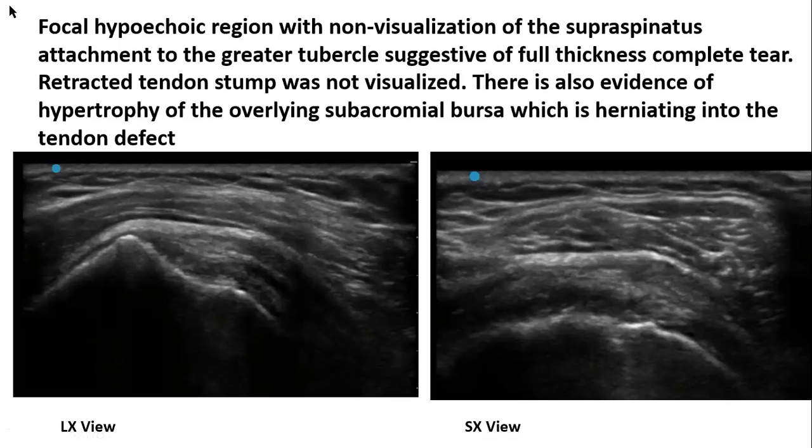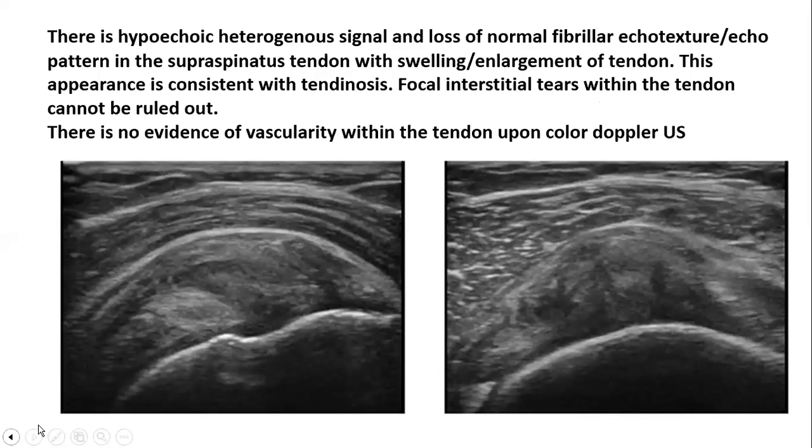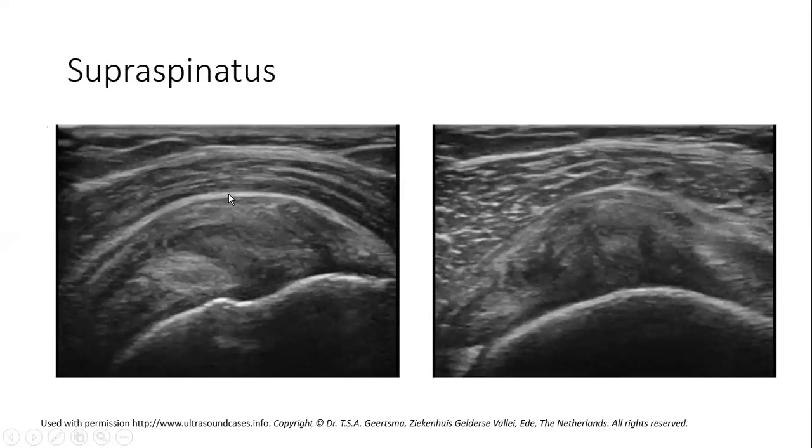And now let's go back to this one here. See how this is rounded, and the bird beak view is rounded. So I don't think it's gone. The tendon is still there, although the tendon doesn't look healthy. Make sense? Yes, but the slide on the right side? This one? That's still round, because the round shape is intact. You can see the round shape here, right? Okay, yeah. So just think, the filler is still there, whatever is filling it up.